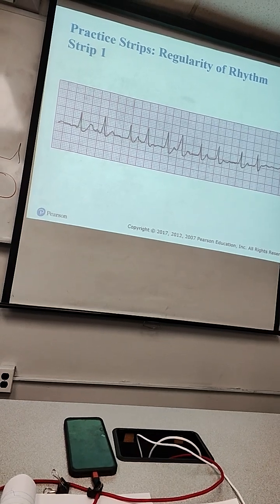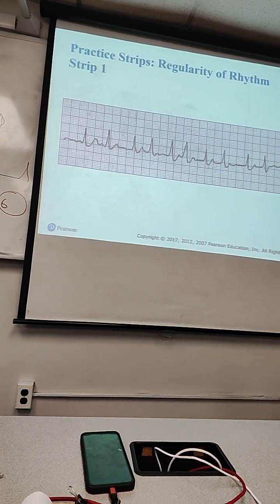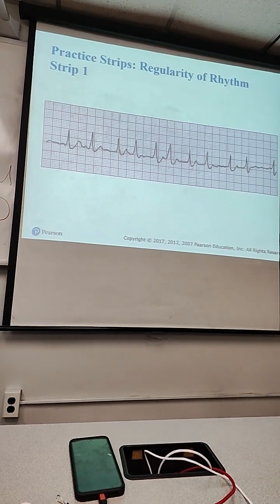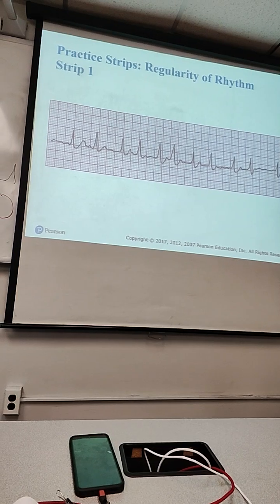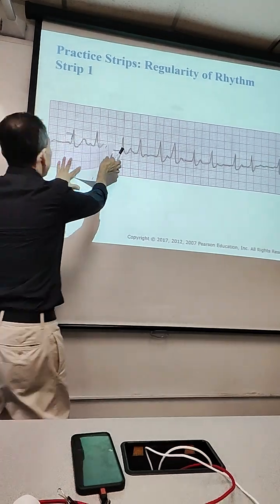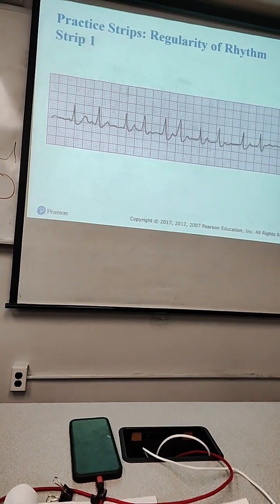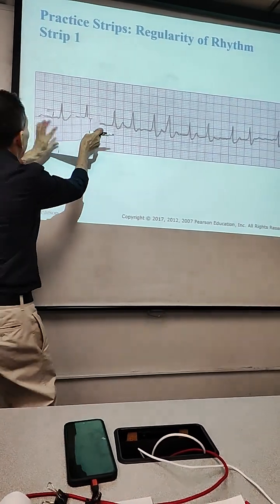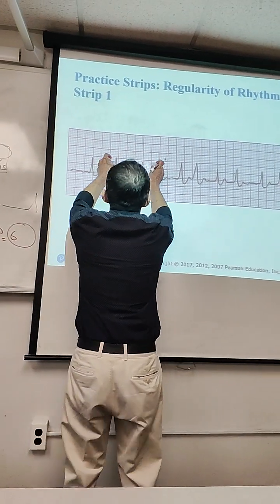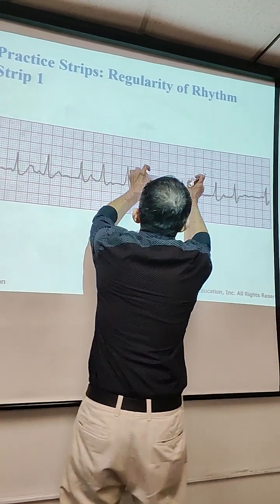Okay, regular or irregular? I think it's irregular. I think it's regular. Look wider. Okay, as soon as I see it, well, you know, like 100 years of experience. Let's use a different color, because I know that one right there is smaller, but that one right there looks wider. Don't let anything get in your way. Is it wider? Is it? Irregular then.